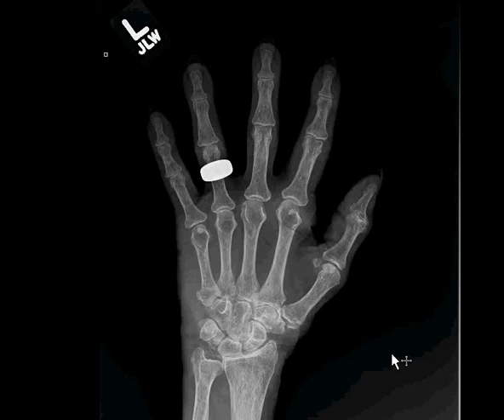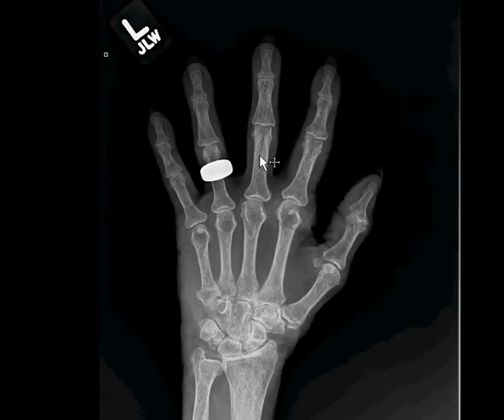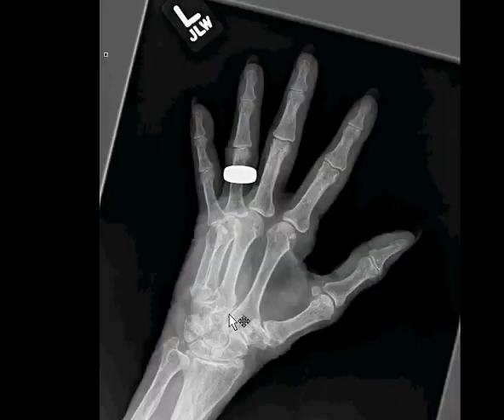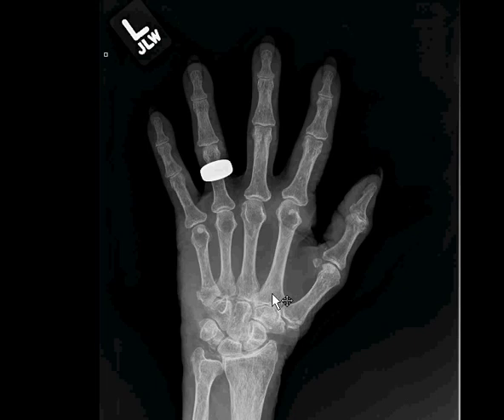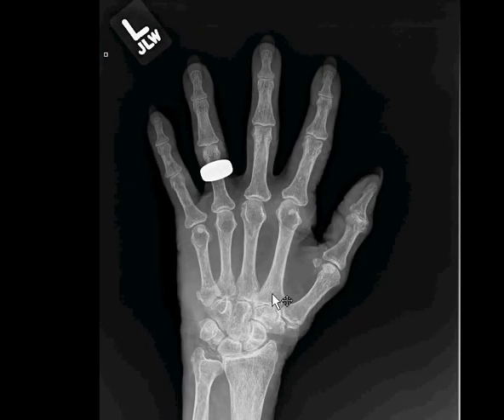Hi, this is a note trying to explain the importance of indicating to the radiologist when there are focal symptoms. So this patient came in. I noticed that they had had hand radiographs about 2 weeks ago as well, and the tech note was filled out exactly as it ought to be. The views were correct.